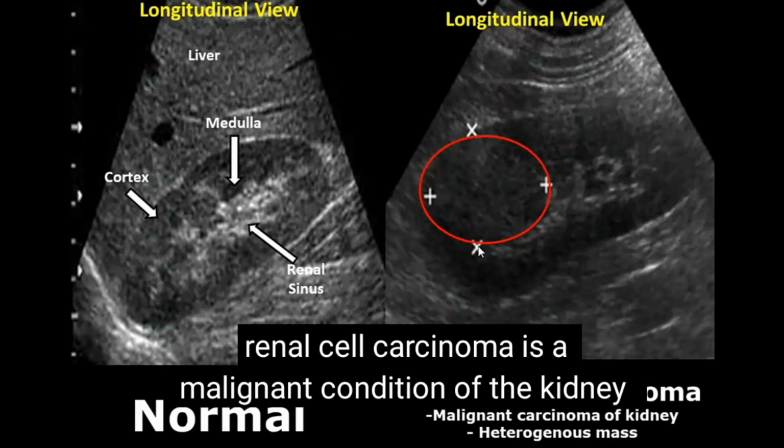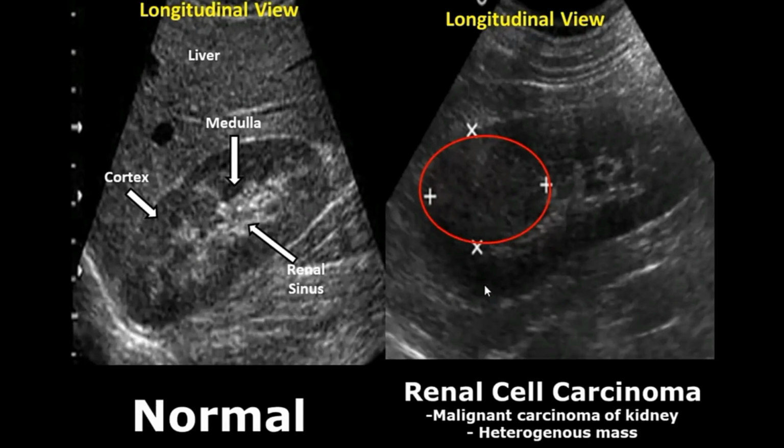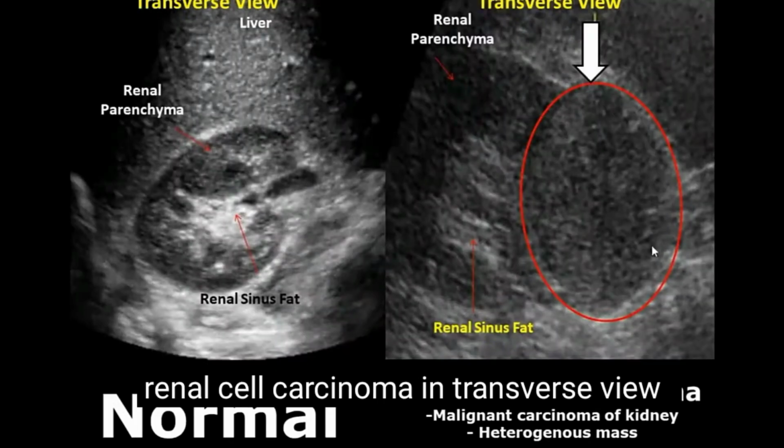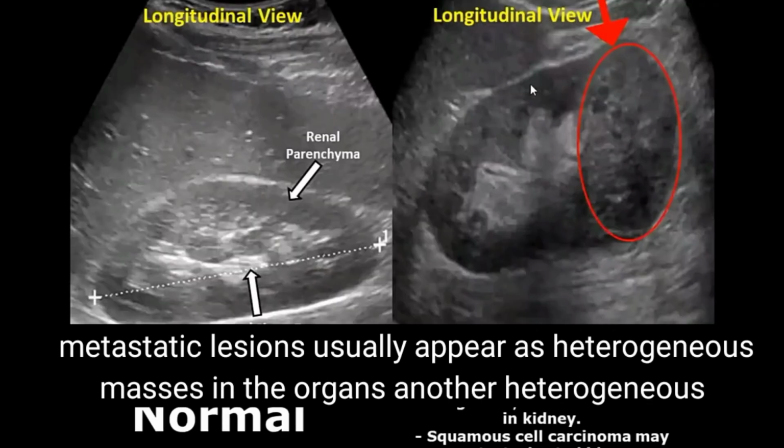Renal cell carcinoma is a malignant condition of the kidney. Here we can see a heterogeneous mass in the upper pole of the right kidney in the longitudinal view. Renal cell carcinoma in transverse view. The heterogeneous mass can be seen here occupying the cortical and medullary regions.